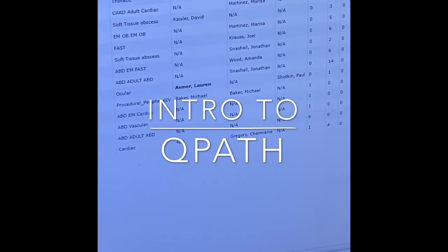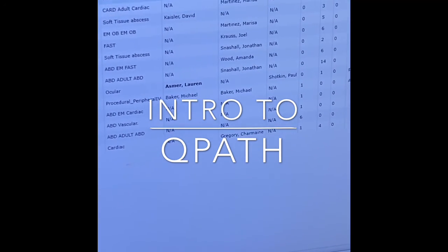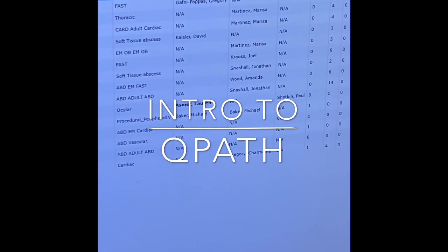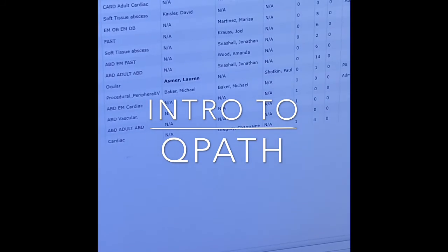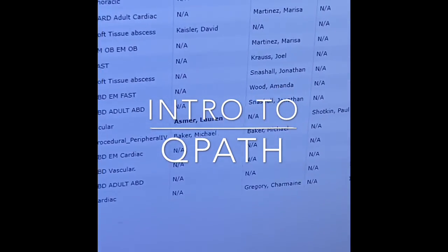The next column is the operator column. This is where all non-attendings should show up. As you can see, some of the names are bold. If they are bold, this means that there is more than one operator on the study, but only the first name will show up. To view who else is on the study, you can hover over the name and this pops up.